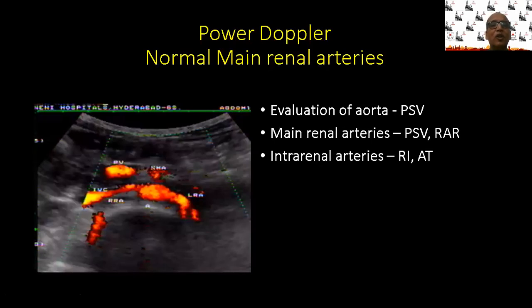Now, the role of color Doppler in kidney disease per se is predominantly to look for renovascular hypertension and renal vein thrombosis, in addition to miscellaneous conditions like renal aneurysms or post-biopsy arteriovenous malformations or AVFs. We could diagnose that as well. Color Doppler is an excellent modality, especially in the right setting of a good cooperative patient who is not very obese.